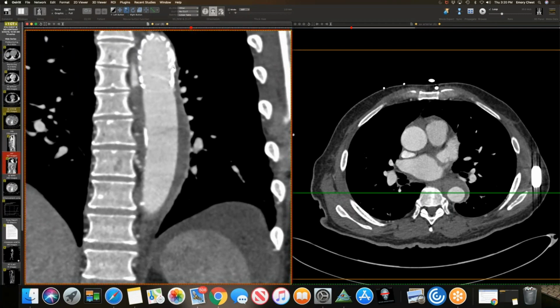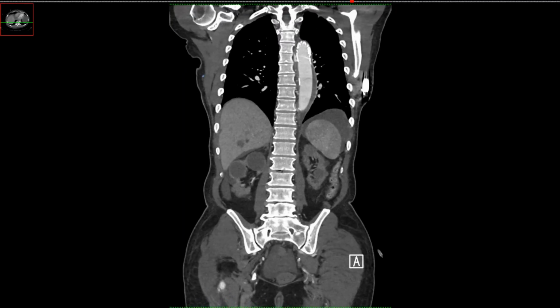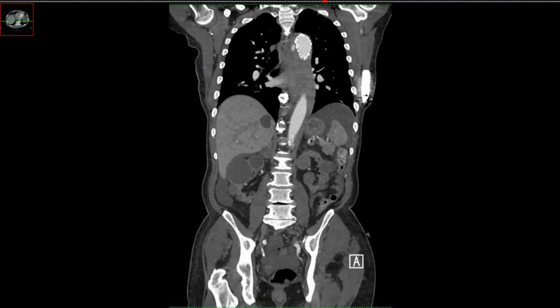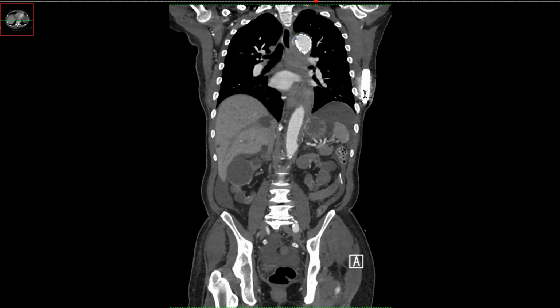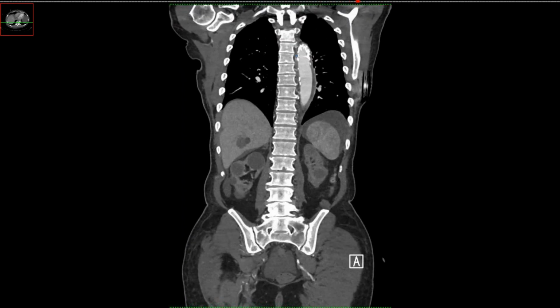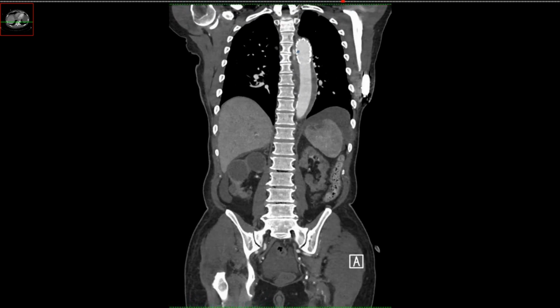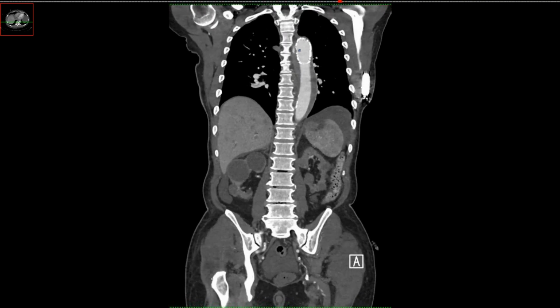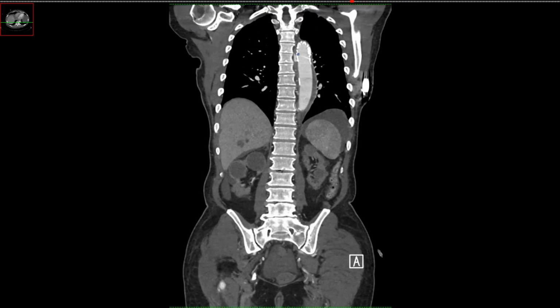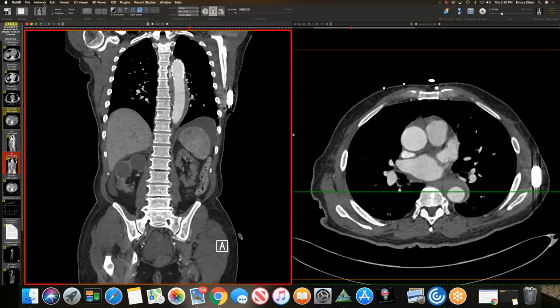There you go. Okay. And then let's see if we can trace that directly to... Yeah. It might be coming from a bronchial artery. At least part of them are, and then if not a bronchial artery, from intercostal arteries. Yeah, intercostal. In other words, if you just zoom in quite a bit, again, if you can.